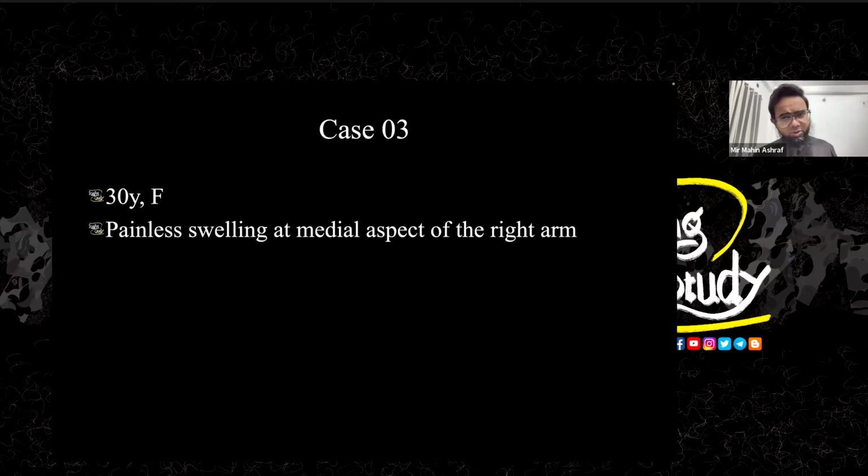Yeah, you can do the phlebogram also. Yeah, definitely. So if you go for the hepatic angiogram, then you can also see the arterial flow. Okay, so the liver is getting supply from the portal phase also. So if you can get the 3-phase view, then definitely the picture will be better, I think. Okay, so anyway, let's jump into case number 3.